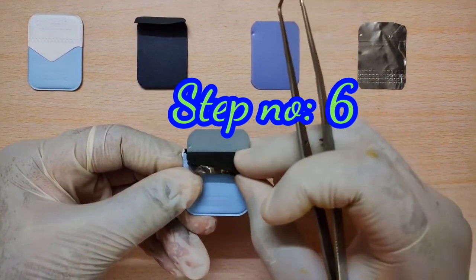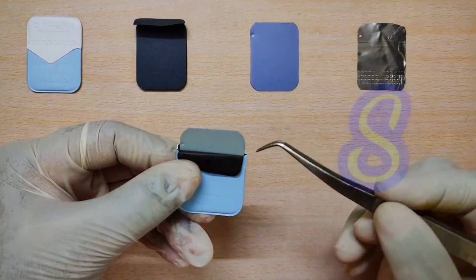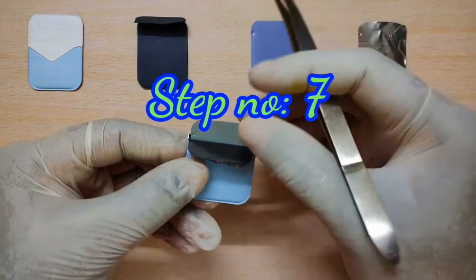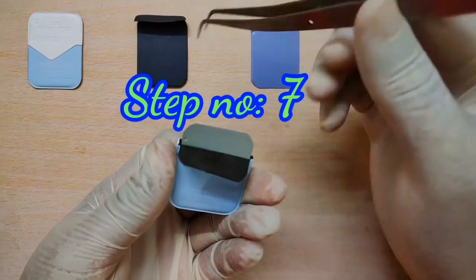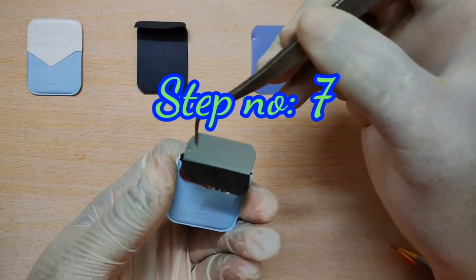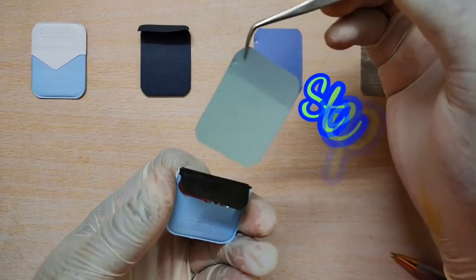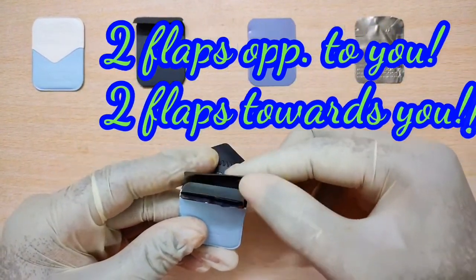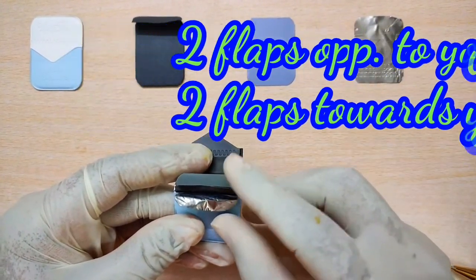Now you can see the somewhat white color film under the safe light. So clip the X-ray film clip on the upper left corner of the film, and without touching the film with your fingers, gently pull the film out by sliding to process it. Don't forget this mantra: 2 flaps opposite to you and 2 flaps towards you. There you go.